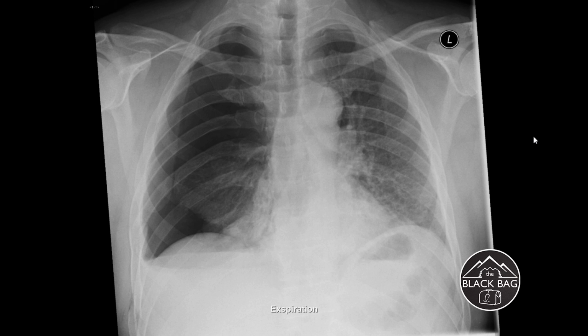Okay, so here's an example of a traumatic pneumothorax, and hopefully if someone comes to the emergency department, either the EMS or the patient or someone with them is going to give you an idea of what has happened in the mechanism of injury, so you know how to start your triage as far as a trauma patient goes. But let's say that nobody came with the patient and you didn't know, but they were hypoxic and you got an X-ray and now you're surprised.